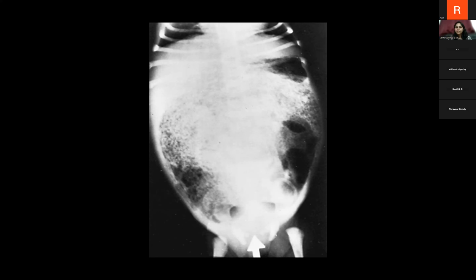So for the students who are not getting anything from this, you go stepwise. Okay. What age of the patient? This is a pediatric patient. So we have to consider the conditions which are seen only in pediatric patients. Then what is the part imaged here? This is abdomen. This is a radiograph of abdomen. What are we seeing here? This is the mottled appearance or soap bubble sign.